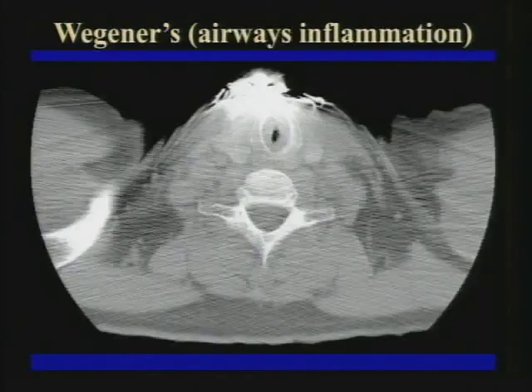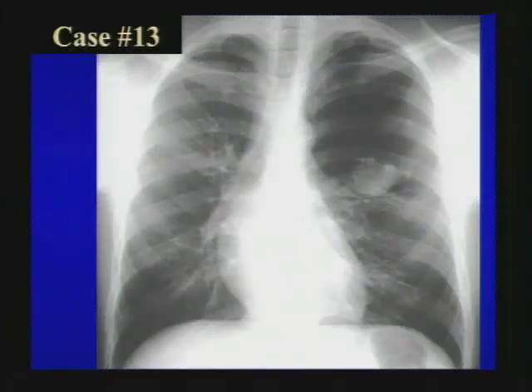This is hemorrhage. Wegener's can also present with airways disease. So it's in that differential, right, of tracheal wall thickening. Amyloid, sarcoid, Wegener's, relapsing polychondritis. Those are the big ones. Really a great example of this disease.